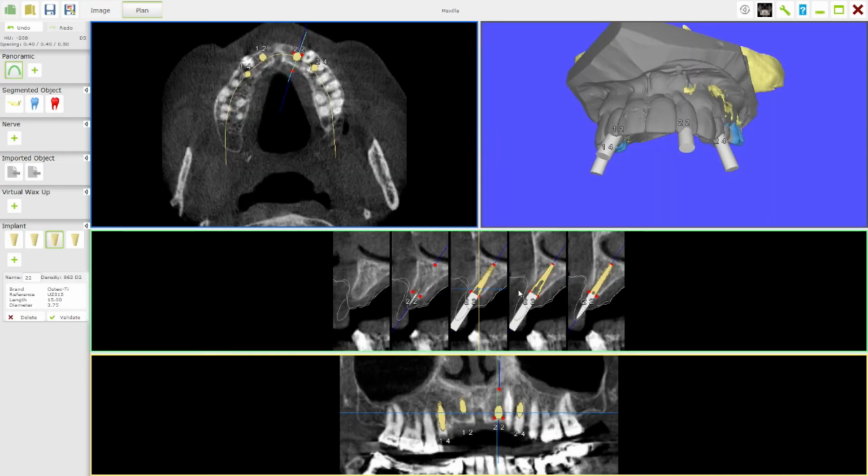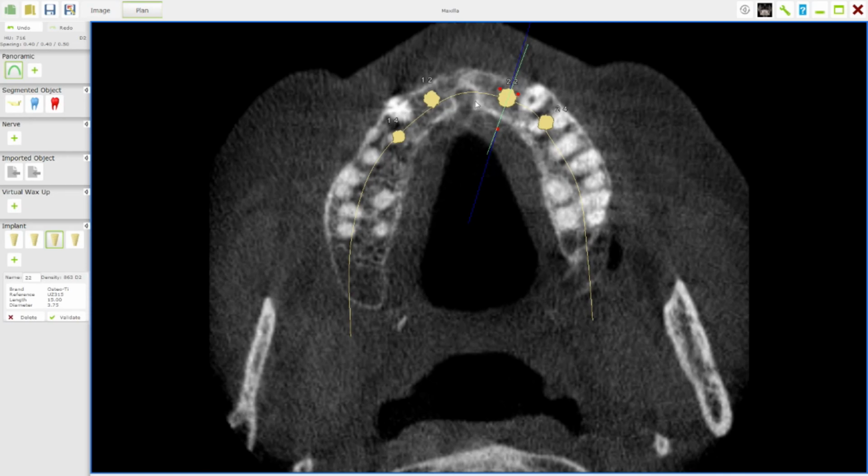So this is helping me to navigate around. If I go to the actual view, which is on our image or our pane 3 here, we can see I have again the green, which is showing us the position of the transverse slice. I have the blue, which is showing us the angular inclination of our implant.